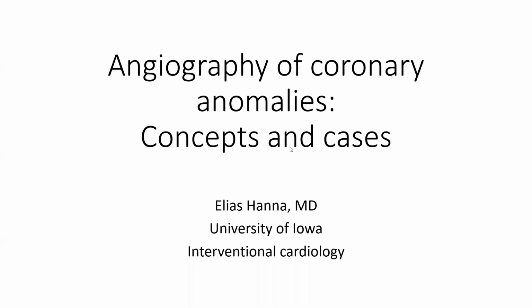I will talk today about angiography of anomalous coronaries. I will provide a lot of cases, and that will hopefully also be a good exercise in understanding coronary angiographies and views, not just coronary anomalies.